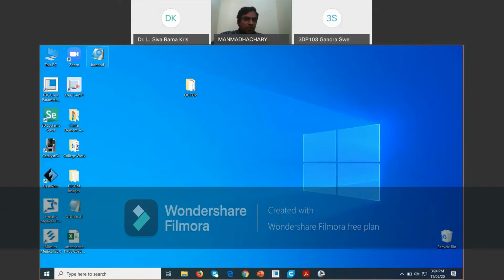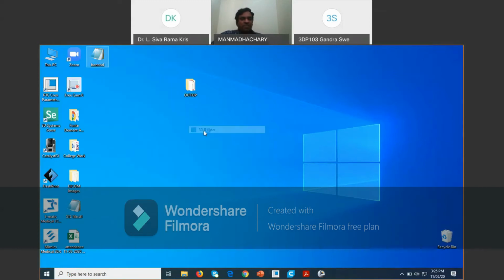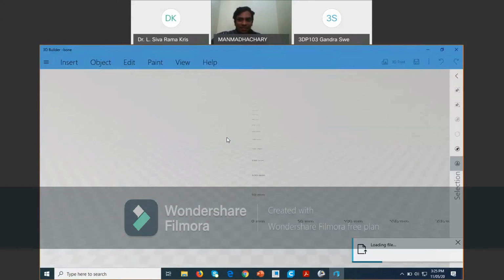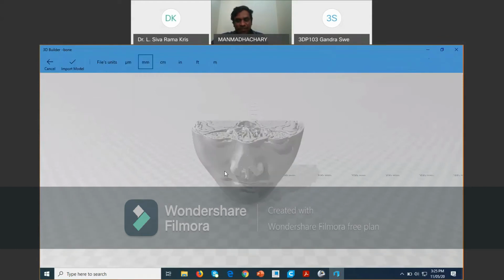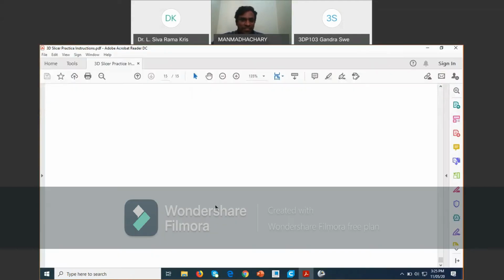I'm just showing you the 3D model. Open with the viewer. Loading the file here. Okay, this is our object here, and now we will go one by one.